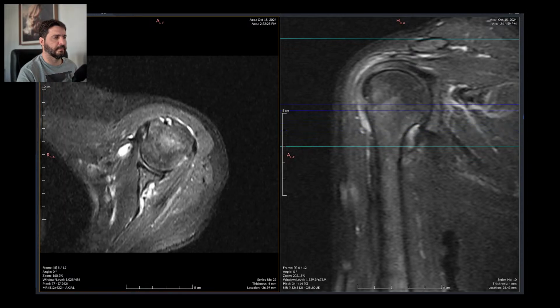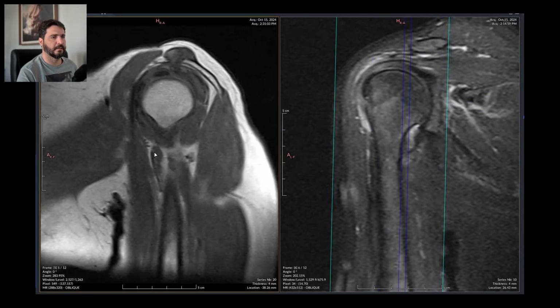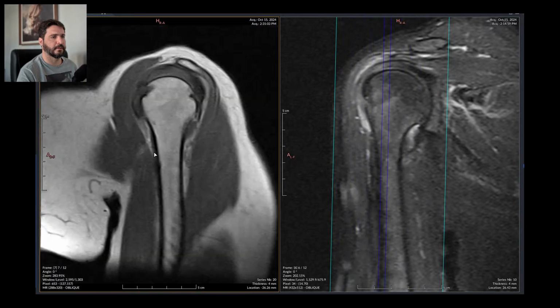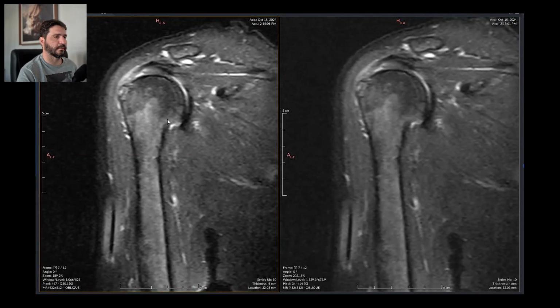But I guess we can manage to say stuff about this exam for sure. There is arthrosis, there is synovitis, also a bunch of signs of effusions and whatnot.